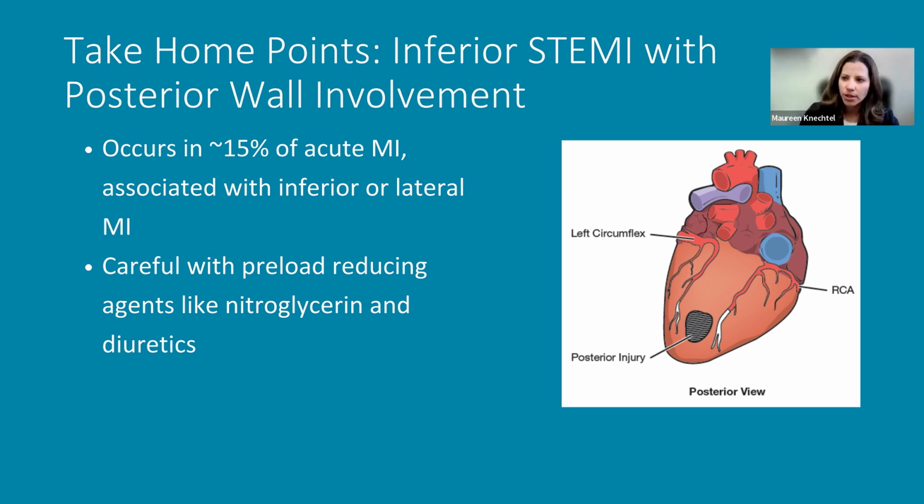Things like that can be a little bit more concerning. So that's posterior wall involvement, and we see that most commonly with inferior STEMIs if it does occur.